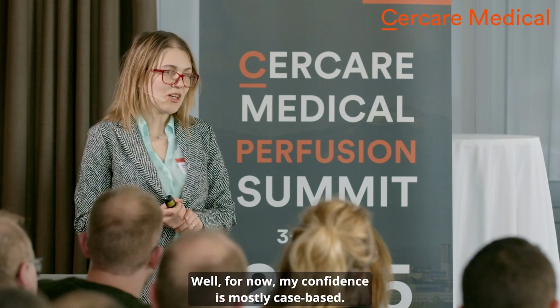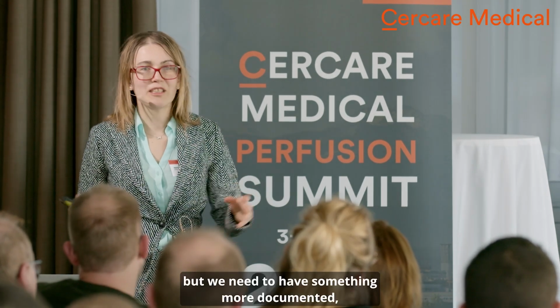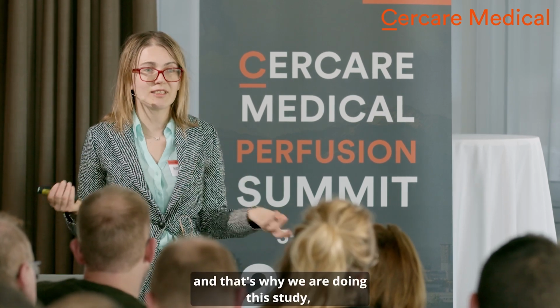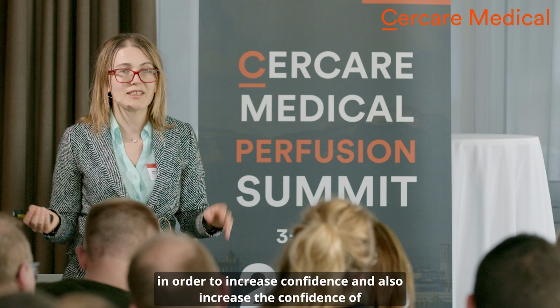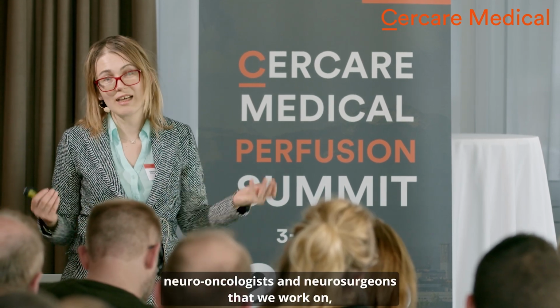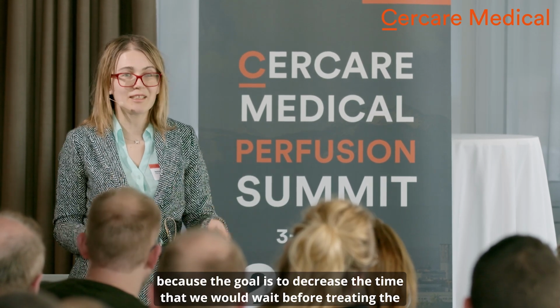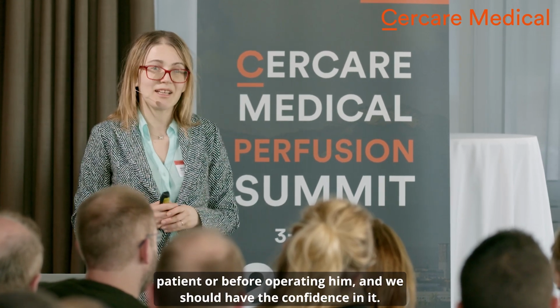For now, my confidence is mostly case-based. It works well on the cases that I have seen, but we need to have something more documented, and that's why we are doing this study, multicentric and also with PET correlation, in order to increase our confidence and also the confidence of the neuro-oncologists and neurosurgeons that we work with, because the goal is to decrease the time that we would wait before treating the patient or before operating, and we should have confidence in it.